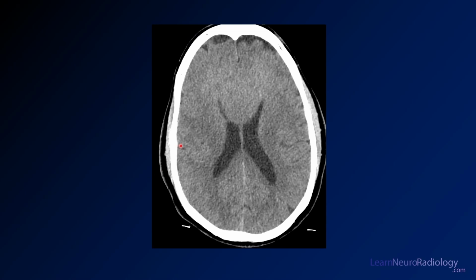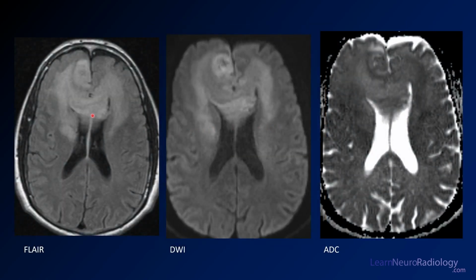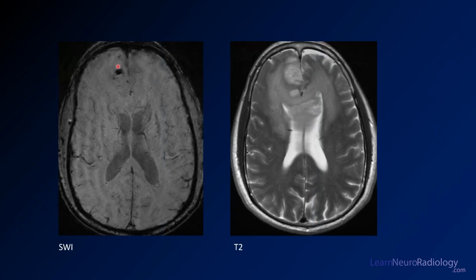Now here's a CT image, which I didn't have in the interactive portion. It just confirms the findings that you saw. Expansion of the corpus callosum here, mass-like expansion of the frontal lobes, mass effect on the frontal horns. So we're worried that there's a mass there. Again, FLAIR hyperintensity, kind of a nodular area of a mass, abnormal diffusion, abnormal ADC as well, which wasn't in the interactive session. Here you see that area of susceptibility that we pointed out. That's probably blood products, probably in the middle of that most nodular looking area.